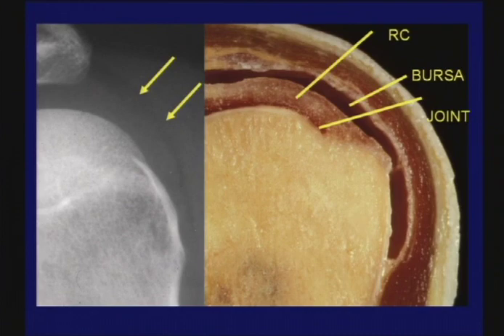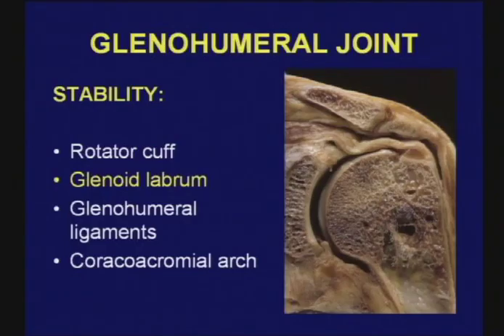You can see the fat around the humeral head. Now, I'd like to be able to tell you that if you don't see that, there is a significant abnormality of the shoulder, but that would be untrue. There's a higher likelihood there's something wrong, but it is not specific. Bursitis, rotator cuff tears can certainly obliterate this particular fat plane, but it may be hard to see in very muscular people as well. So you should look for it, but the value is not great. It's probably pretty good, but not great.